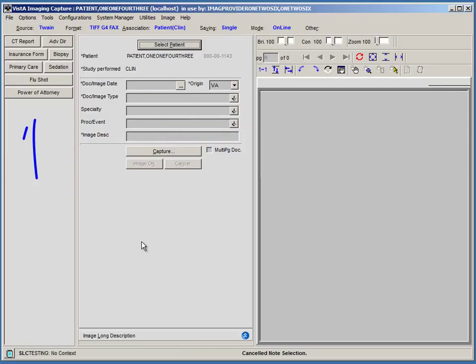Positioning the configuration buttons on the left will enable the image box to be larger, making the image easier to view. The Help menu and sub-menu items have also changed in Patch 151. The option Vista Imaging Clinical Capture User Guide is actually a link to the current Clinical Capture User Manual on the Vista Imaging SharePoint. Other outdated Help menu items have been removed.